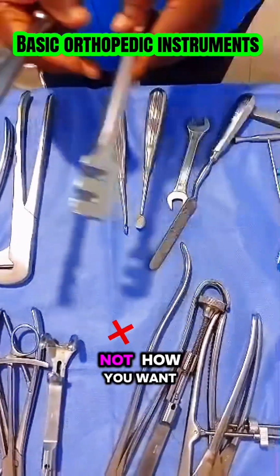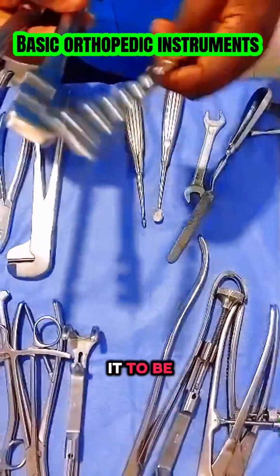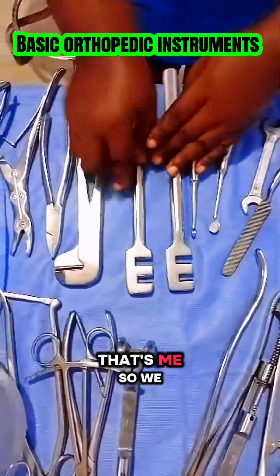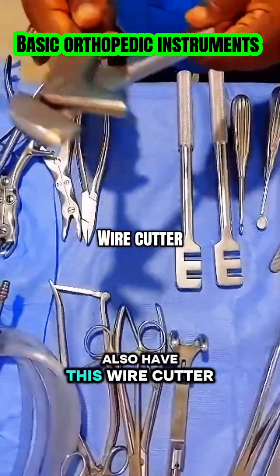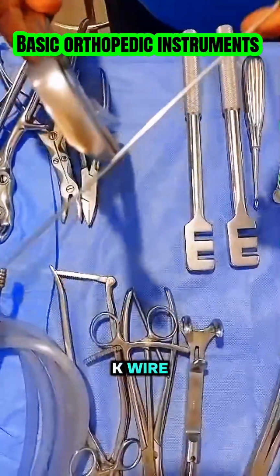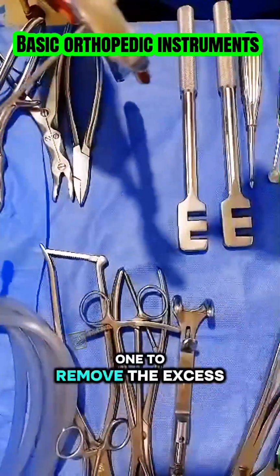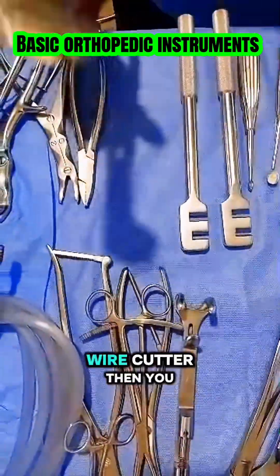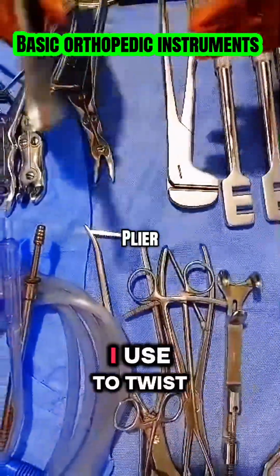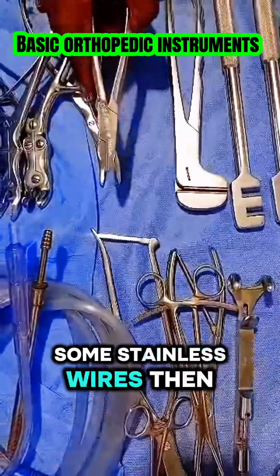So if the plate is not how you want it to be, you can use the plate bender and bend it. So we also have this wire cutter. After putting your K-wire, you can use this one to remove the excess. So this is a wire cutter. Then you have pliers to twist wire. You can use it to twist some stainless steel wires.